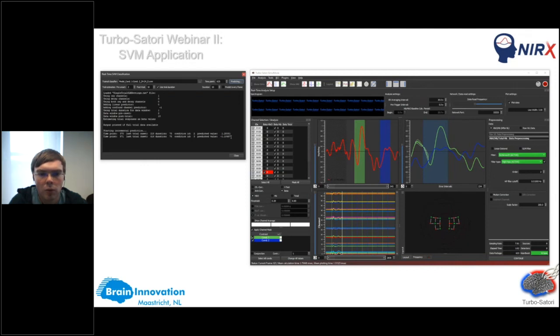So what does this predicted value mean? The support vector, what I was talking about, has these specific margins, and the margin of this vector is basically the value 1. So if there is now a condition which is close to 1, it basically shows that this is close to the margin. If the value here is pretty low, it's very close to the support vector. So it's a very uncertain value. So the higher the value here, the more certain, or the further away from the support vector it is.